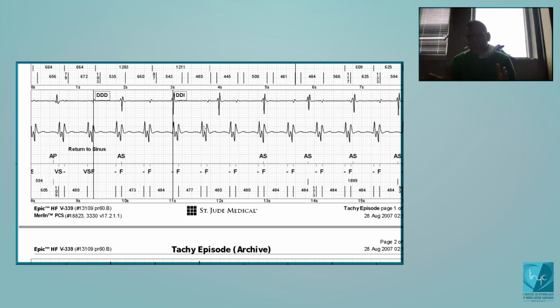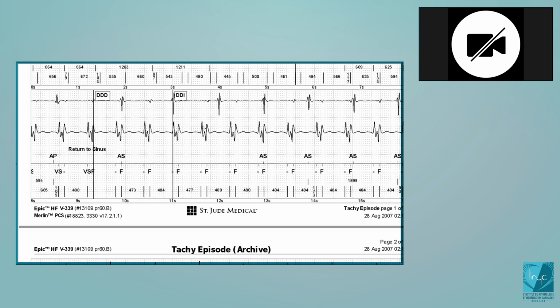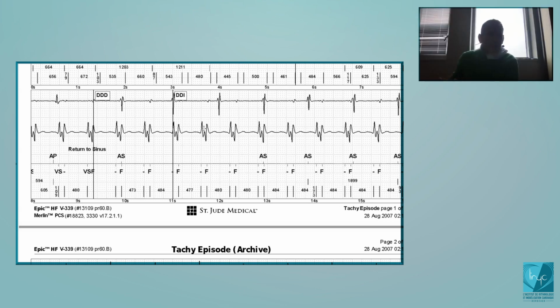Okay, when you program this parameter, that's the limit for sensing a real arrhythmia also. So that's why you cannot program it very long. You cannot program a blanking of 200 milliseconds, for example, because if you program like this, you cannot sense an episode of tachycardia faster than 300 beats per minute. So in Abbott, you have two choices.